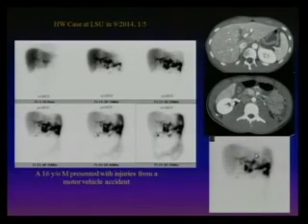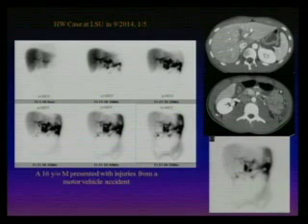Okay, who's continuing? Oh, your turn. Doesn't matter, that's all ER cases. So that's a patient who came with trauma, 16 years old, male. CT shows some laceration and fluid around the gallbladder fossa, and they want to know whether the patient has a leak.